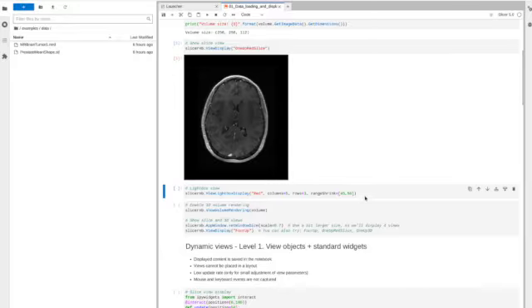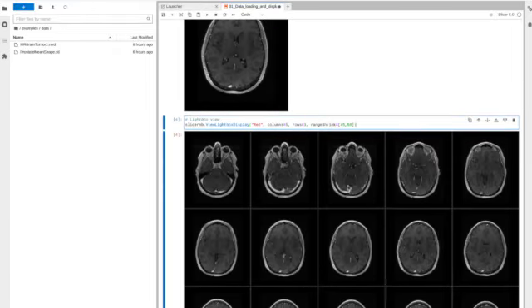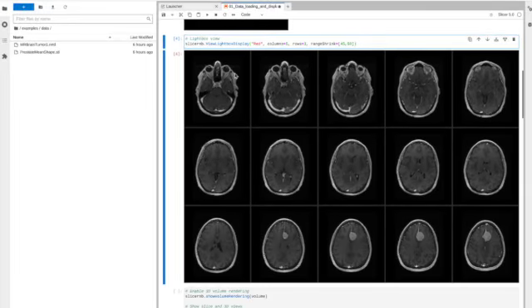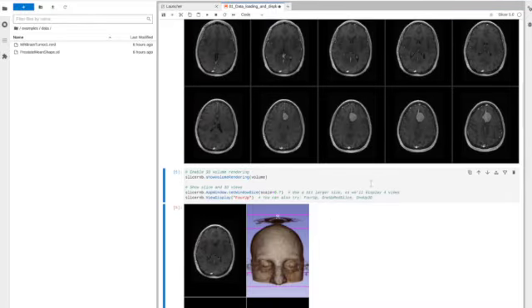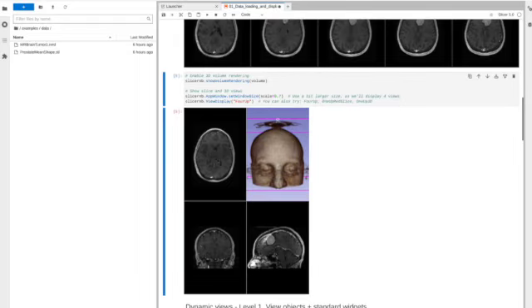Okay, so here's just all from the same angle, and sometimes it refers to them as colors. So that's why you see this is the red angle, and so this is a tumor. You'll start to see as we progress through the tissue slices, the tumor pop up here. Okay, and here's the 3 angles, as well as a rendering. This is called a 4-up view.